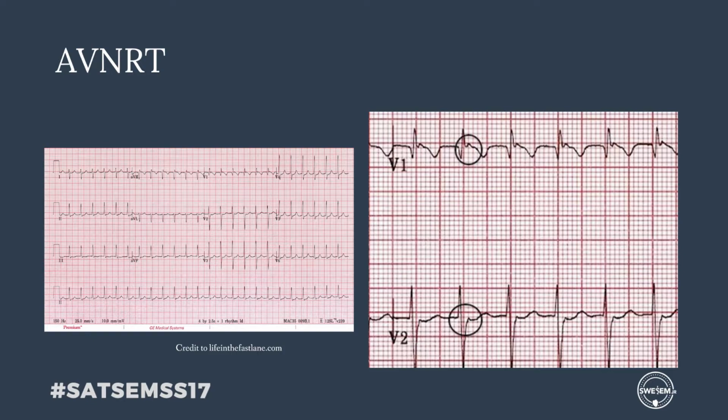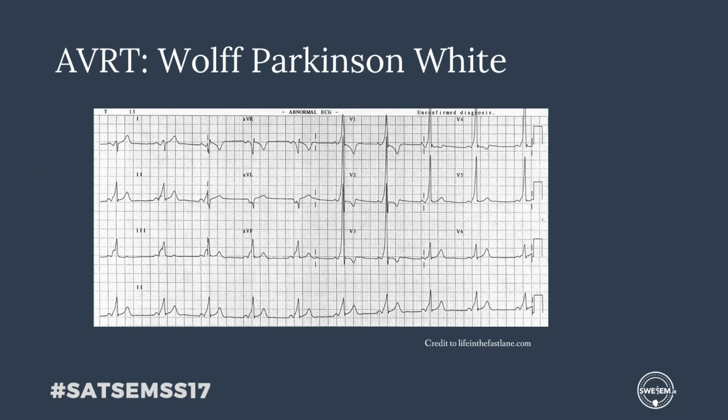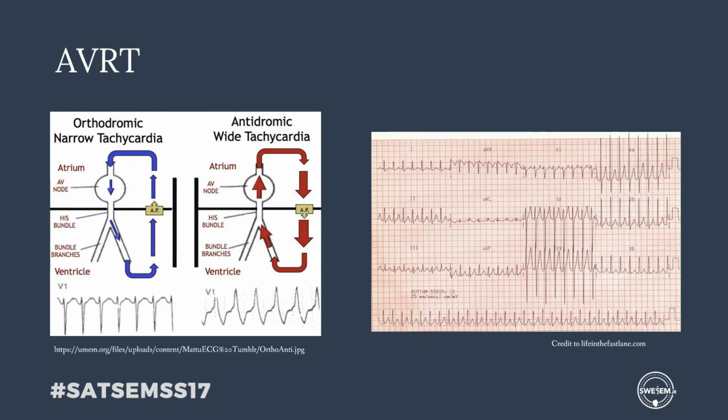So we're going to move on to AVRTs. Now, an AVRT stands for an atrioventricular re-entry tachycardia. This means that a patient with an AVRT will have an anatomical re-entry circuit that is outside of the AV node. These come in two different types.